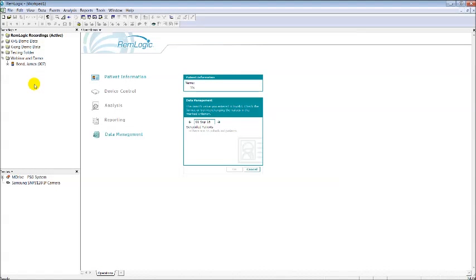Now we shall start with the demonstration in RemLogic software. There are a few assumptions here when I'm showing the demonstration. I will assume that this patient, James Bond, has done a PSG study with 6 hours of data the previous night, and then this patient has gotten off from the PSG study, let's say now it's already 2 hours from the PSG study last night.